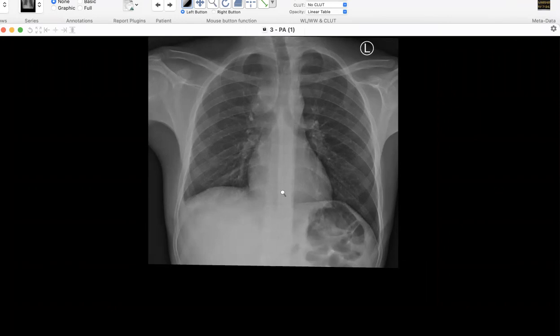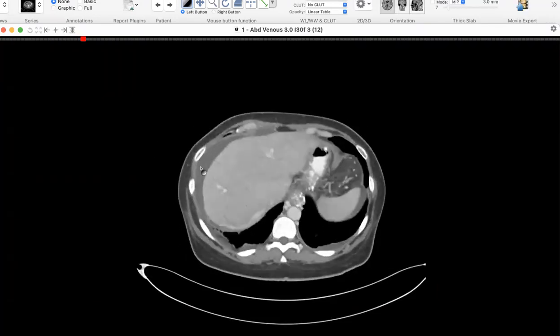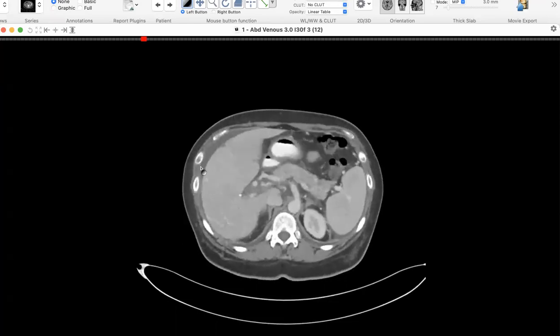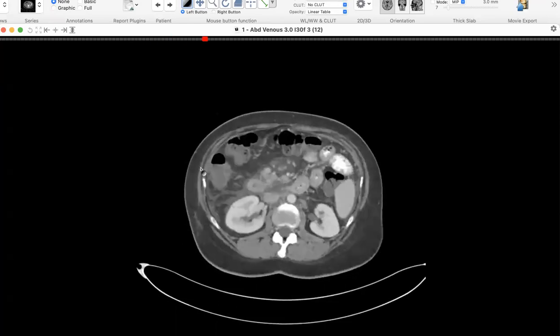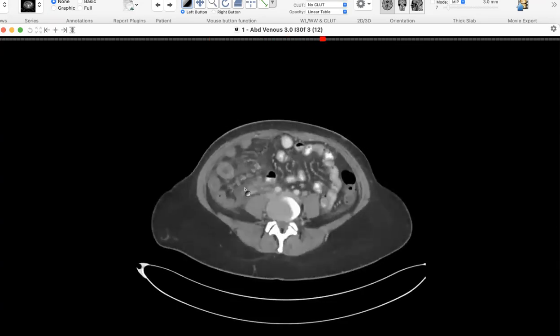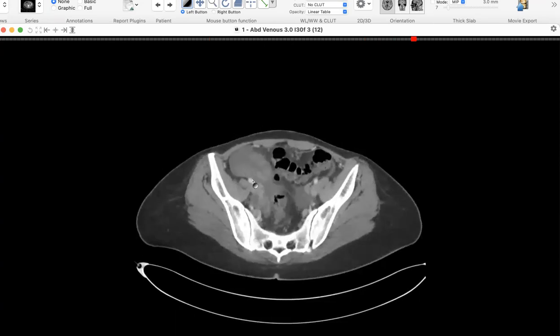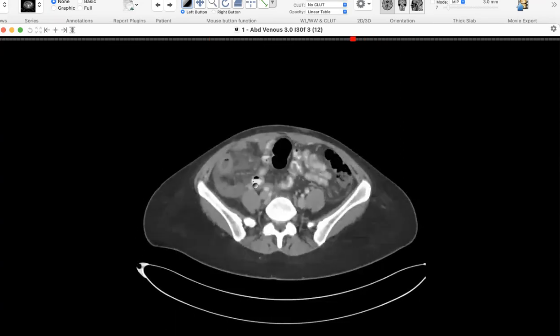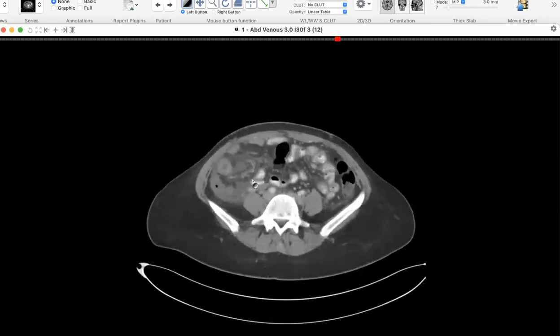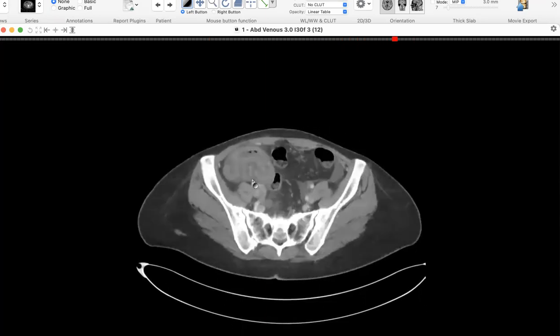Last case. So had you asked for the previous, I think you would have got the diagnosis more easily. So always keep that in mind. And here what you have is a congested mesentery, free fluid, circumferential thickening, layering, and I don't know, is there something missing to say that this is not venous ischemia? Hypoenhancement.